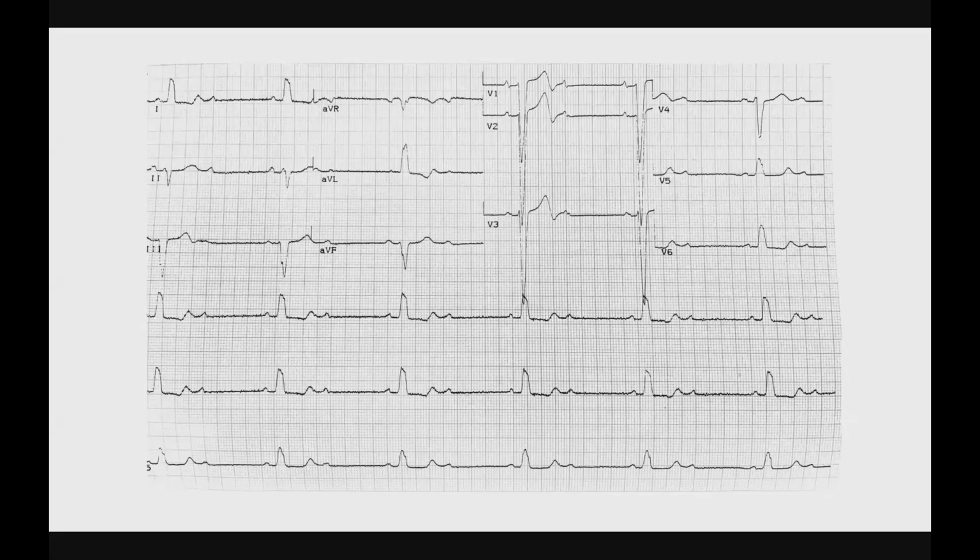Yes, sir. This is an ECG showing a sinus rhythm. The rate is regular. Rate comes to around 40 per minute.